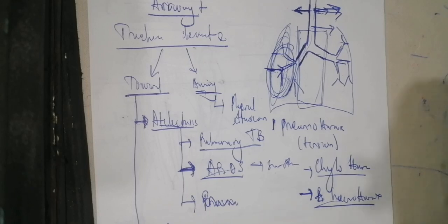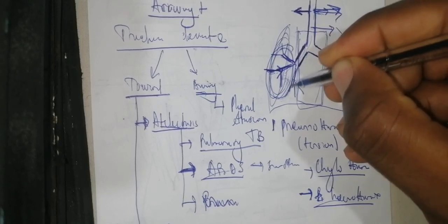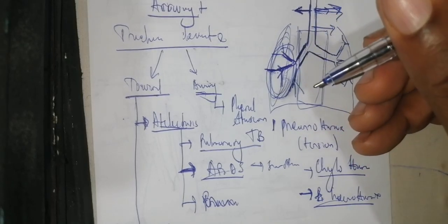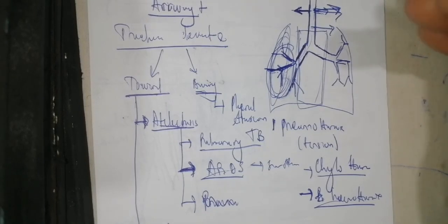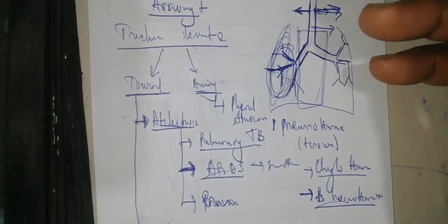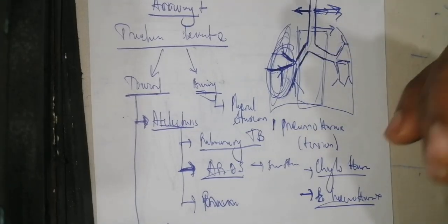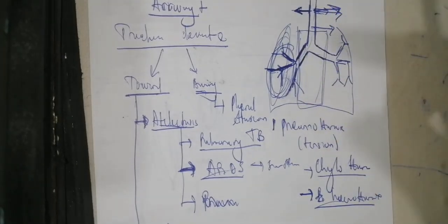So those are the different elements that you have to understand. So now the next element after the airways, you need to speak about the breathing. Basically, I've also forgotten another element that is very important in the airway. In the airway, you need to visualize the bronchi. And when you visualize the bronchi, there's a particular sign that is going to be shown, but I'm going to discuss it more when you're going to visualize the part of the breathing. That one is called the air bronchogram. Air bronchogram is when you see a dark line of lucency within an opacity. So when you visualize it like that, you can know that it's air bronchogram.